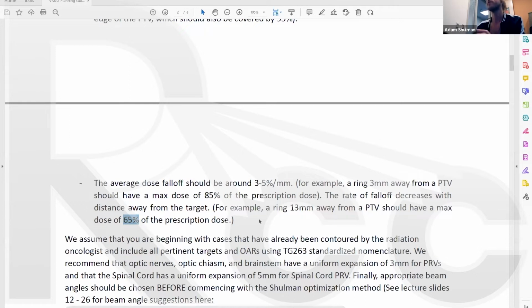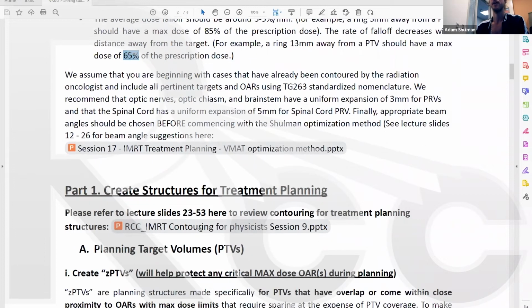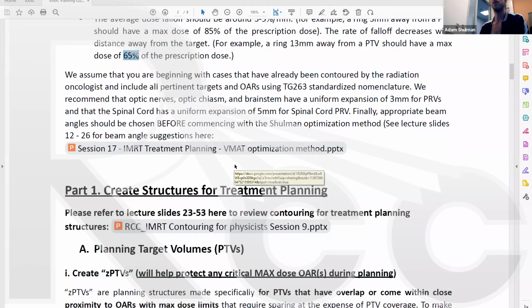So these are our rules of thumb that you'll always need to think about when you're doing these contour creations. There's a nice little link here. Ben has embedded some of our PowerPoint presentations from other presenters here, and he's got some other helpful documents embedded inside. So the big thing to remember are these rules of thumb and these ideas of how we're contouring. And now we will get into the actual contouring.